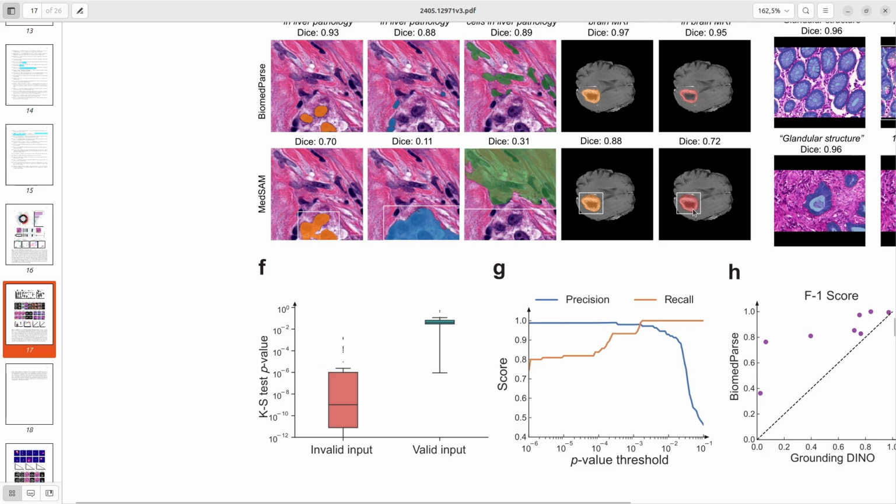And here what you can see colored in orange or reddish is a pixel by pixel mask predicted by BiomedParse. And because it's using pixel by pixel masks, it's now state of the art regarding segmentation accuracy, especially for complex shapes like tumors. It even outperforms MedSam.